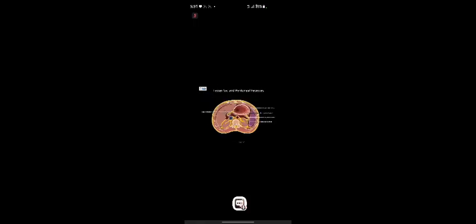So where are we? We are in the lesser sac. And this is what exam cases are made up of. We are in the lesser sac. It's a lesser sac abscess. So this anatomy is critical, right? Otherwise, I'm not going to be satisfied as an examiner if you tell me that there is an abdominal abscess. Where is it? Tell me. So this is lesser sac abscess.